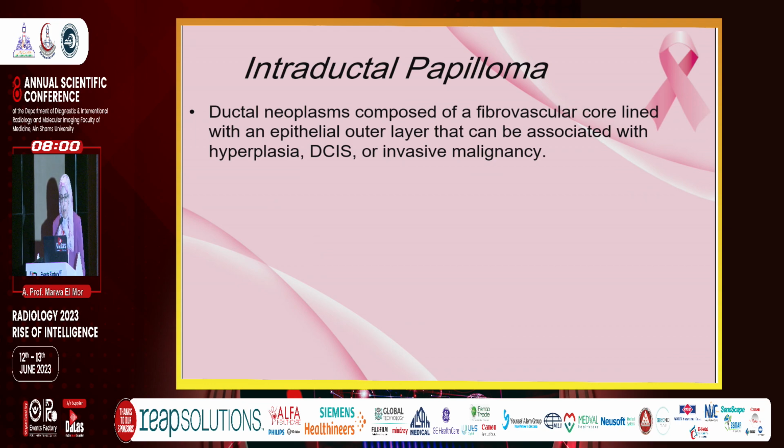Intraductal papilloma is another pathological condition that can yield non-mass enhancement on MRI. It is a ductal neoplasm composed of a fibrovascular core lined with an epithelial outer layer that can be associated with hyperplasia, DCIS, or invasive malignancy, typically arising in a central duct.